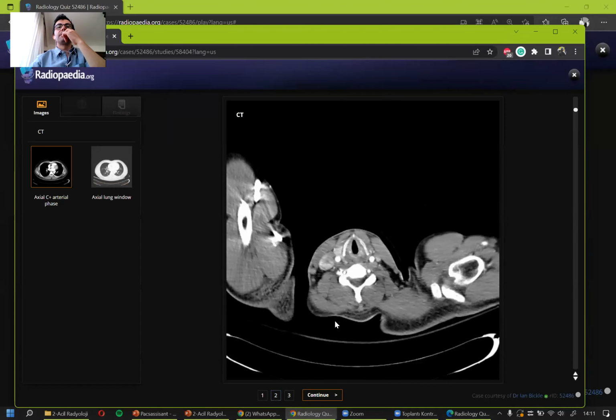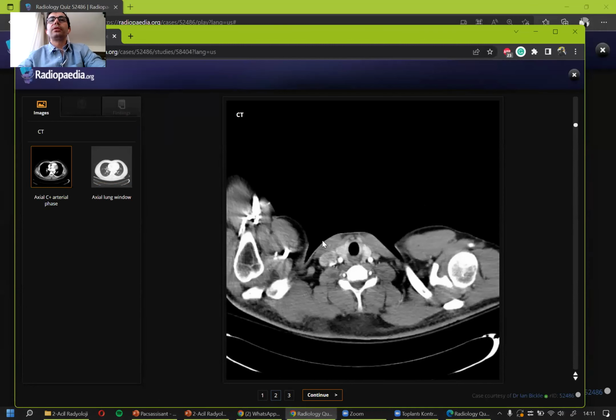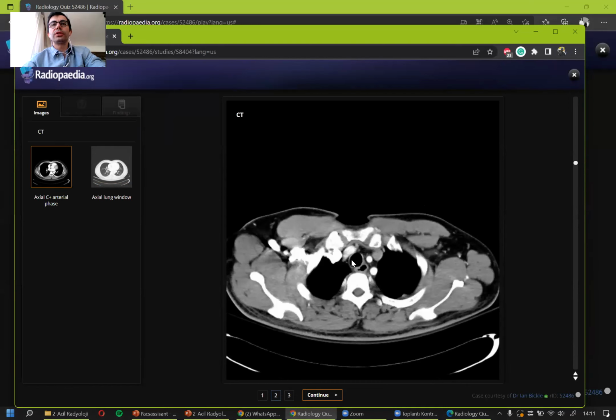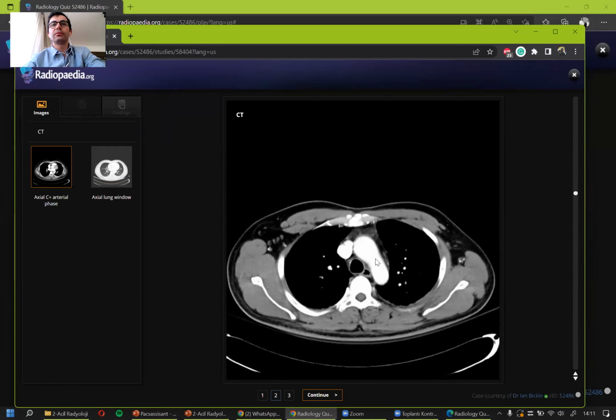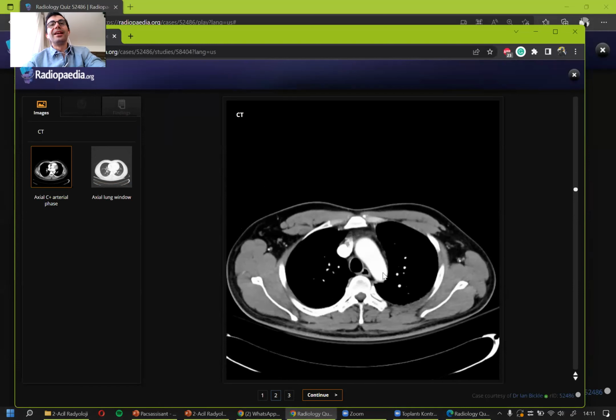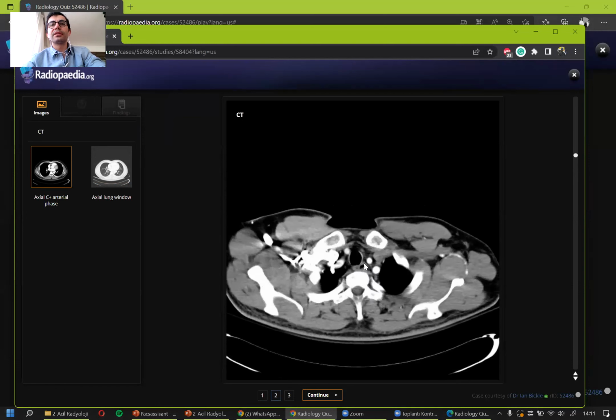Okay, I'm starting from the top. We did this before. Let's quickly do it again. I'm seeing the trachea. I'm seeing the thyroid gland, right? These two dots are carotid arteries. As I go down, they will originate from the arcus aorta, right? This carotid originates from somewhere else, but anyway. I'm seeing the subclavians, which are going to the arms.